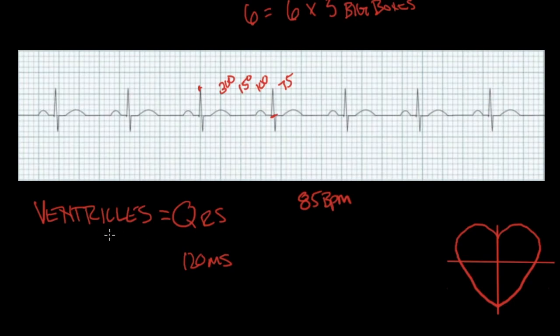The next thing I want to look at is my QRS complex positive or negative? We see we kind of have a little bit of a biphasic thing, but the overall direction of the complex is positive. And just like with those P waves we had talked before, that means my conduction is heading down towards my eyeball. So that's what I want to see.